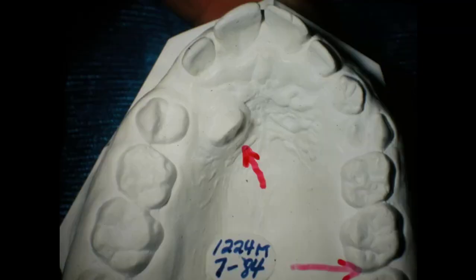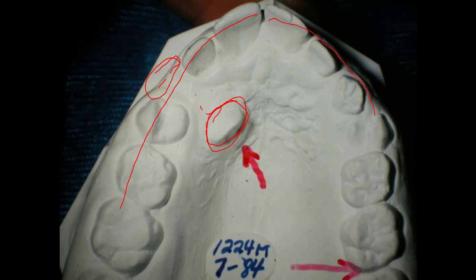But there's a reason for the cuspid erupting here in the palate, the upper right side. It just got on the wrong side of the lateral and came down and opened up here in the palate rather than out here on the labial side of the mouth, and it kind of left this arch form like that, and then it certainly is not symmetrical at all. So we'll have to open this up and kind of expand this out, make space in here, and then pull that cuspid into that space.